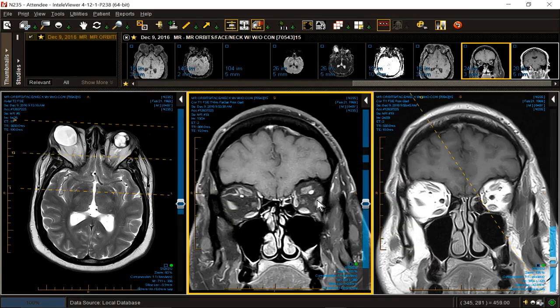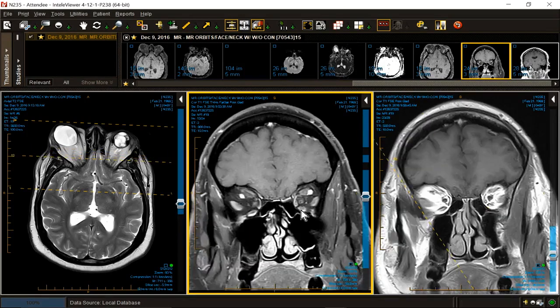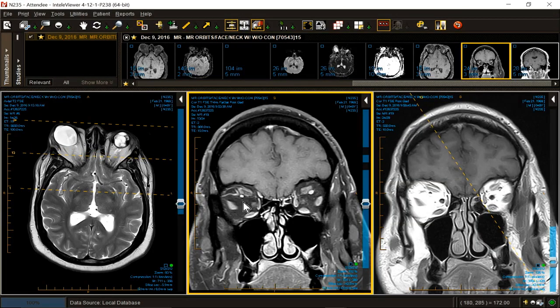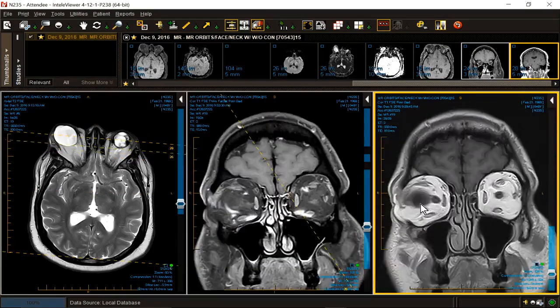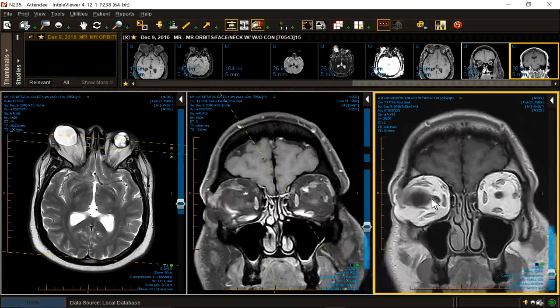They're big. They're all big. It would have been lovely if the medial and inferior rectus were bigger than the others, but they're not. There's a little bit of irregularity within the fat, not much. So not a lot of fibroinflammatory cicatrization present. Lacrimals look fine.